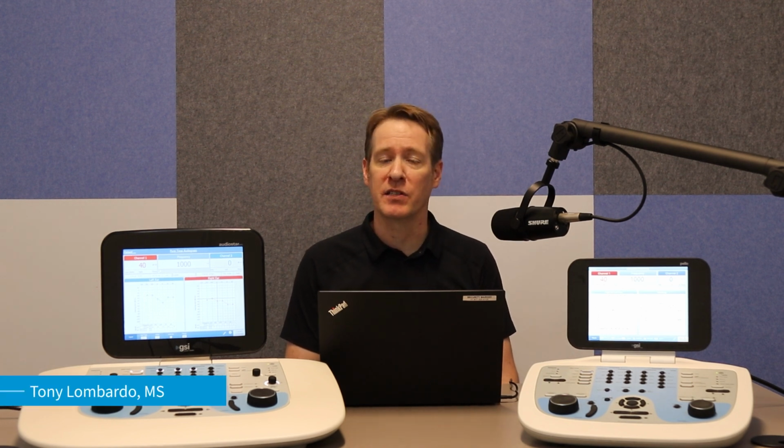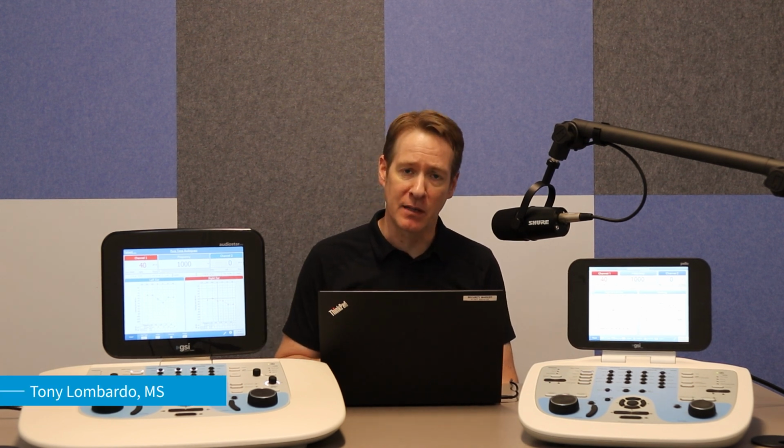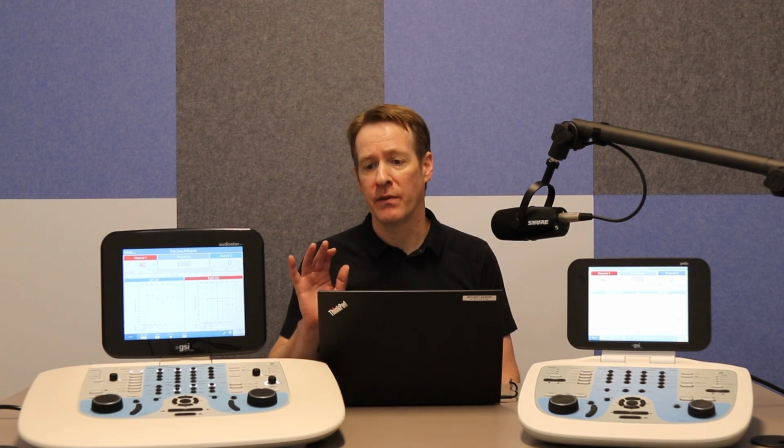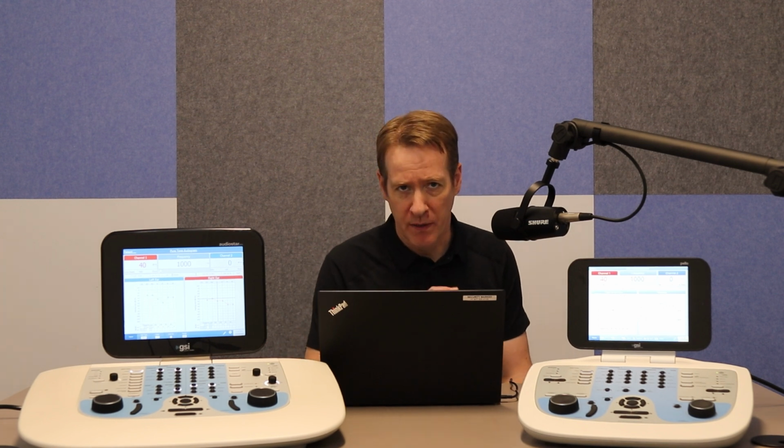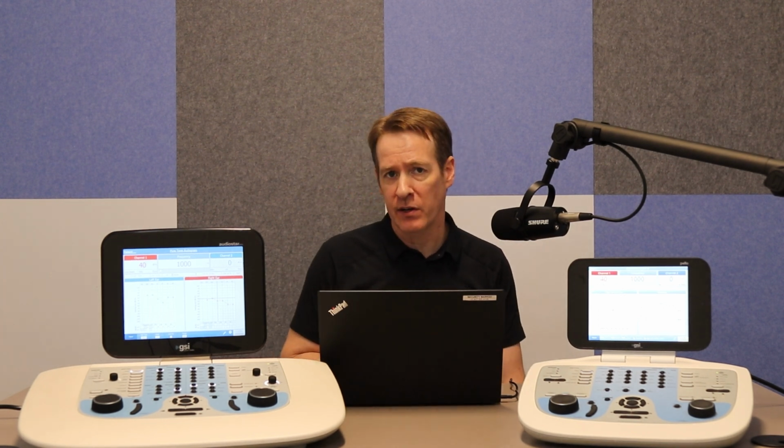I'm one of the audiologists here with Grason-Stadler, and today I'm going to be talking about Wordlist favorites, and this is going to work for both the AudioStar Pro and also very similar to how it works with the Pello. Today we'll be demonstrating on the AudioStar Pro.